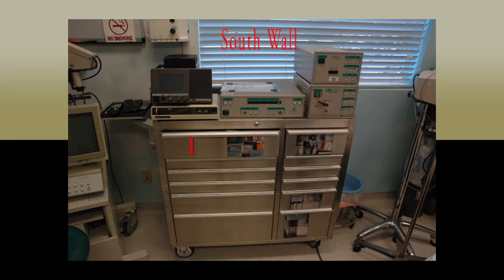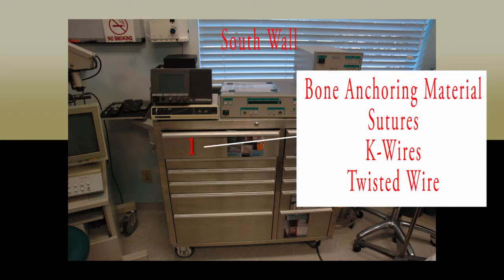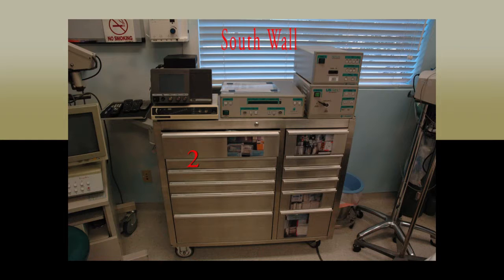Drawer 1 on the left, shown here, is where all the bone anchoring materials, sutures, K-wires, and twisted wire for bunion cases are kept. Drawer 2 houses the instruments that are wrapped in small kits or single instruments wrapped alone.